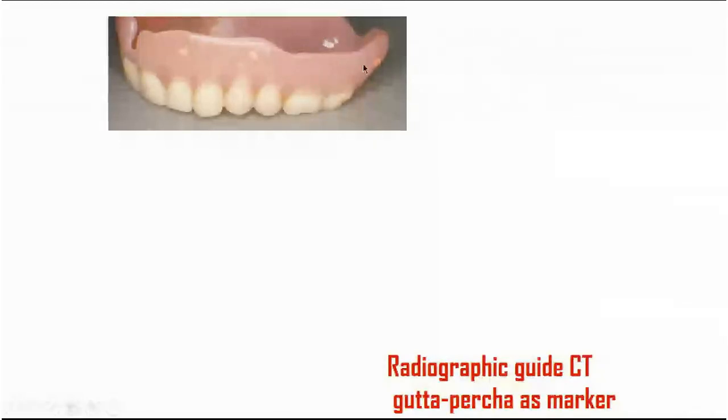appropriate size and the number and locations of the gutta percha markers. When I say that it is an appropriate solution, it should be suitable for a patient both aesthetically and phonetically, and functionally, because those are the three most important elements which will be assessed when we finish everything at the end.